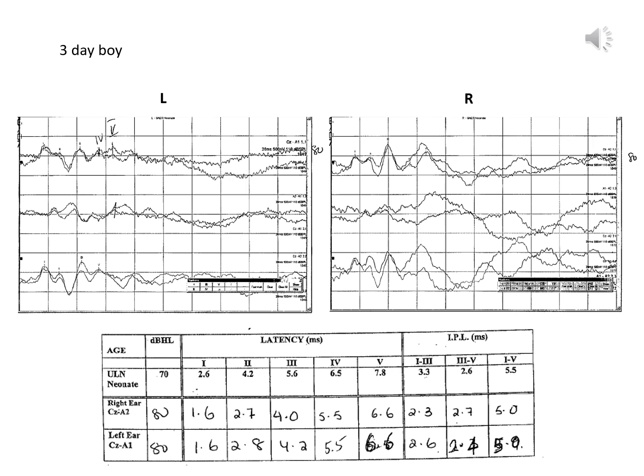The 3-5 numbers, however, for the right ear, it's slightly above. It's 2.7, which is slightly higher than the 2.6 upper limit of normal. So that would make it abnormal. And then our 1-5 are below, and so those are normal. And so overall, this would suggest that there's a 3-5 interpeak latency conduction delay in this baby, suggestive of a possible upper brainstem dysfunction.